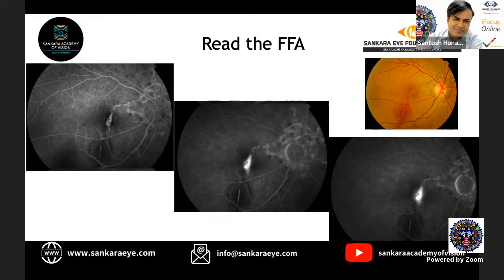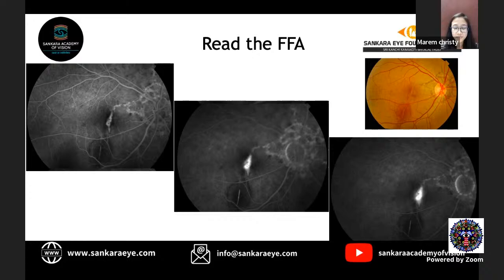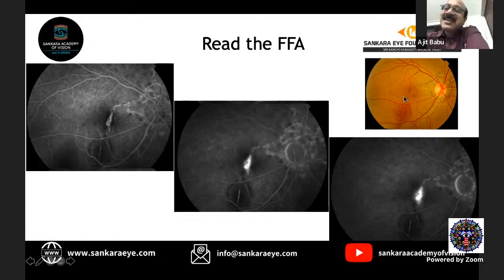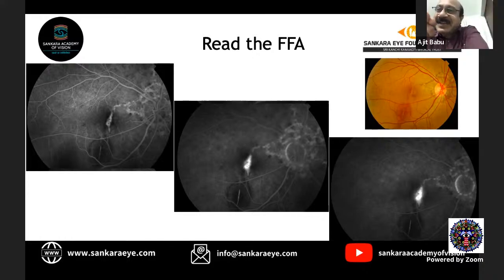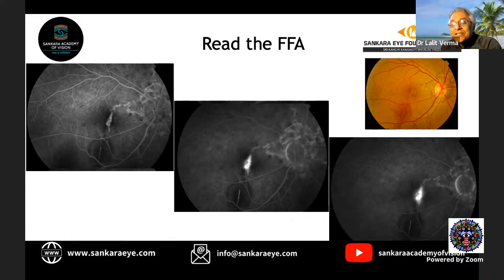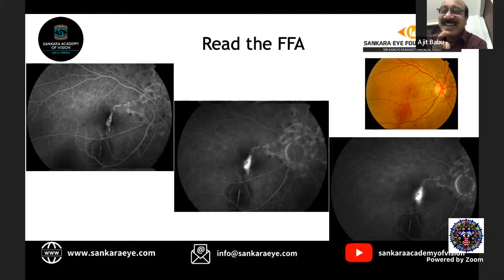Besides the disc findings around the disc, otherwise it looks like acute and chronic CSC. Oh, don't jump at all. I can tell you the diagnosis, but I am describing each one very clearly. Christy and everybody, I hate all these things that you jump to diagnosis. Don't become a super consultant, I'm telling you. That is where we all commit errors in diagnosis. Do you think I don't know the diagnosis here? Ajit Babu knows.